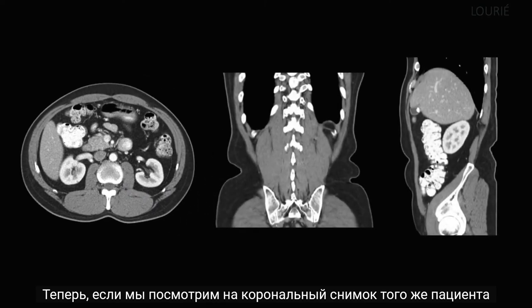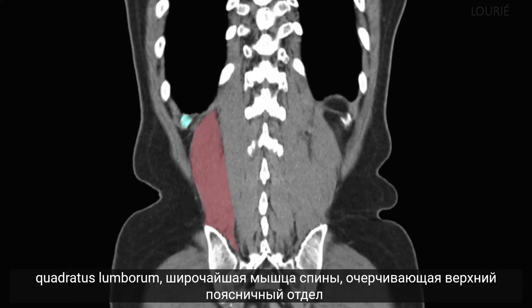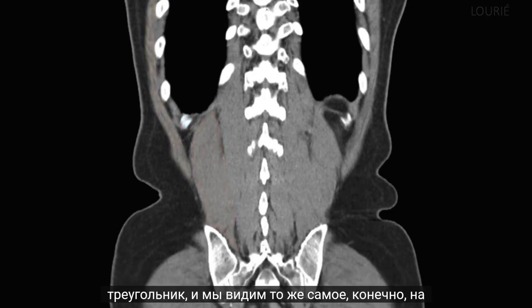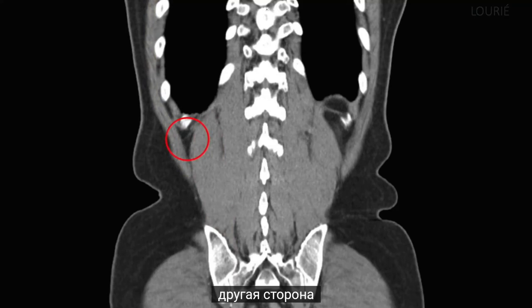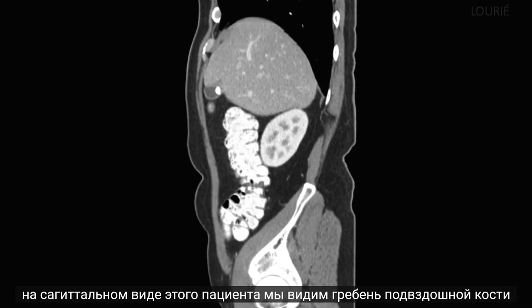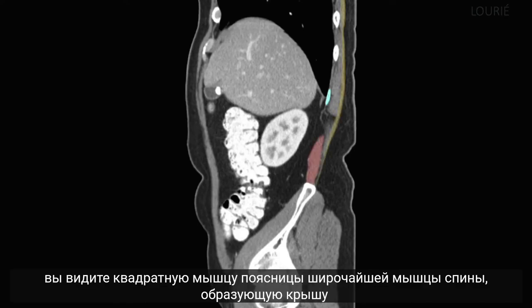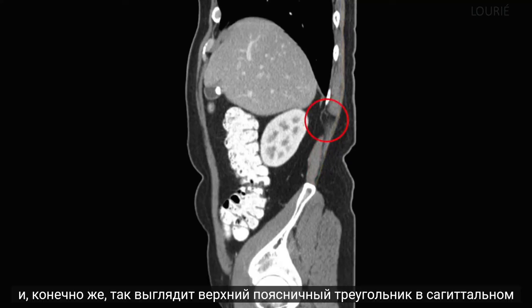Now if we take a look at the coronal view of the same patient, you can see on the patient's right side the blue tip of the 12th rib, quadratus lumborum, the latissimus dorsi, all delineating the superior lumbar triangle. And we can see the same, of course, on the other side. In the sagittal view of this patient, we can see the iliac crest. A little higher, we see the blue tip of the 12th rib. You see the quadratus lumborum, the latissimus dorsi forming the roof, and of course, this is what the superior lumbar triangle looks like in a sagittal view.